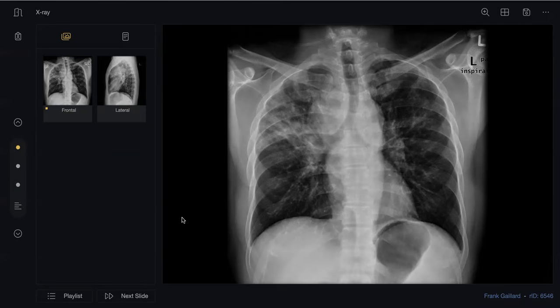A radiograph, PA projection of a skeletally mature patient. There are heterogeneous areas of consolidation with internal air bronchogram in the right upper and mid zone, which are reaching from the hilum towards the periphery. The lung volumes are symmetrical. Some patchy areas of similar density and attenuation are seen in the left upper and mid zone as well. There is mediastinal widening predominantly in the aortic and above the tracheal region. This soft tissue density, predominantly in the right paratracheal region, is making an obtuse angle with the lung margins. However, there is no associated mass effect on the bronchi. There is mild deviation of the trachea, which is not clinically significant on the radiographic images. The rest of the aortic margin, descending aorta, and heart are normal.